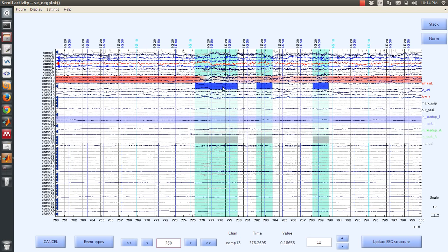Now, these blue bars were marked on an old measure that I was using that required two independent component analyses to run. The first one would just do a quick ICA, and then it would measure the amount of activation of the independent components in each time window, and determine if there were too many components that were unusually active during a period of time, and it would flag it for this blue. And then after that, it would rerun another ICA, ignoring these periods of time.